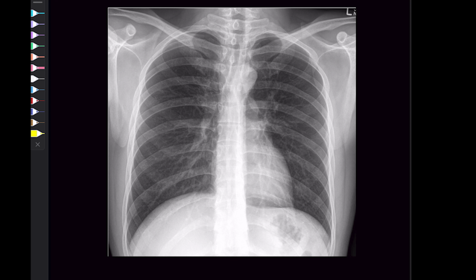First of all, when we approach this X-ray, we all know this structure here is the heart. Now, if I look through this heart, I should look for whether I can see these vertebrae here. If they are easily visible to me, that tells me one very simple factor, that exposure is perfect. So penetration is good, and there is no issue. This is a very important factor, and it helps me to comment upon the penetration.